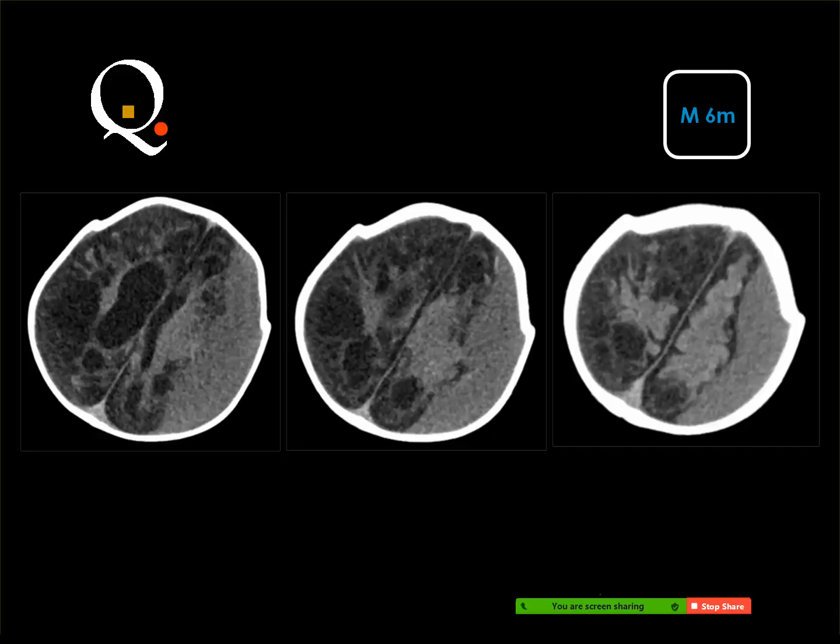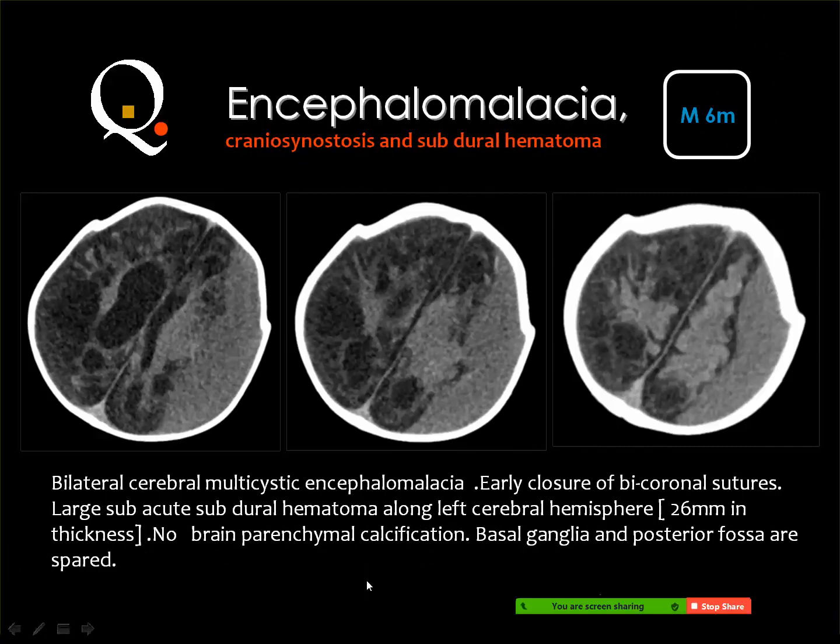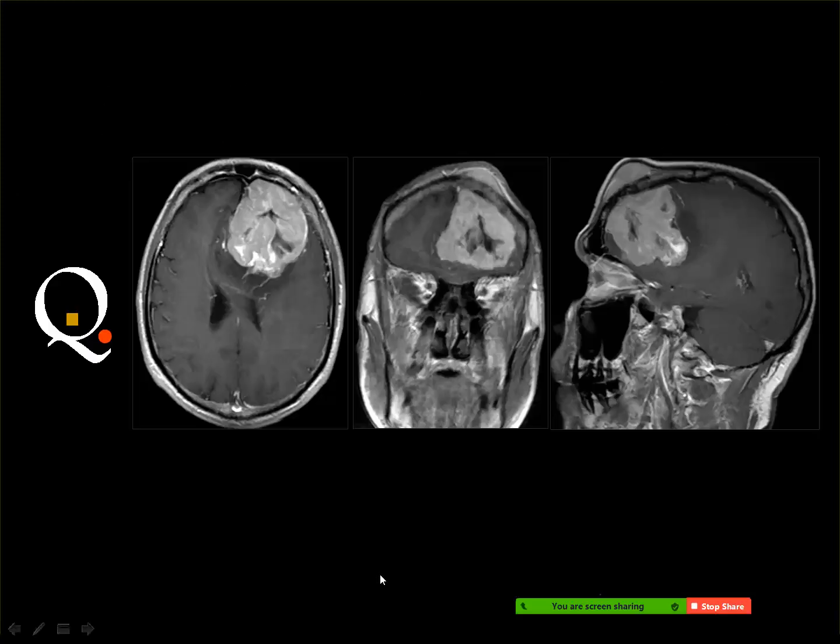Subdural hematoma. Right or left? Left. The remaining brain is normal. No, there is a ventriculomegaly. Yeah, hydrocephalus. Yes, and this will be discussed in great detail in the pediatric section. This is a hypoxic ischemic encephalopathy of an infant with a subdural hematoma. Okay.